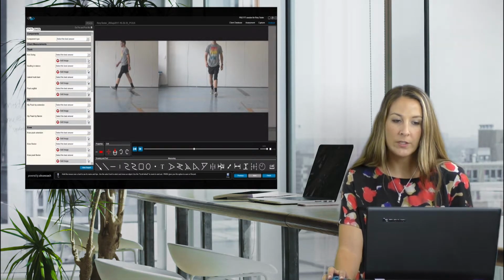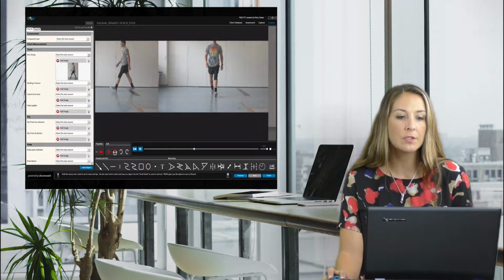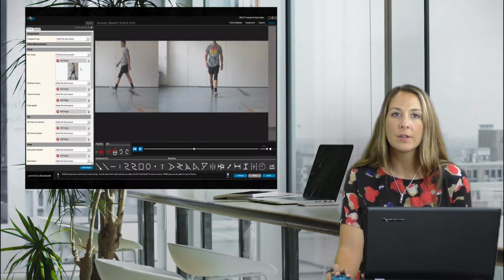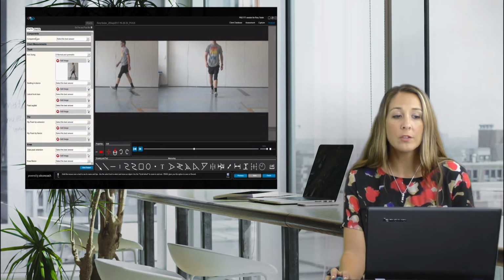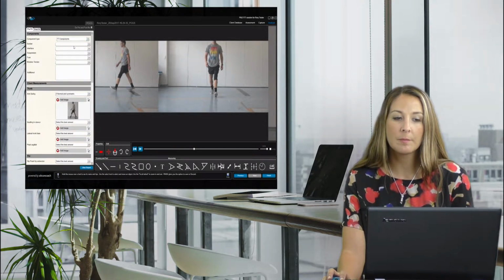And then we just hit this clipboard here, and it puts that image into place for us. And very similar to the way that the web-based software works, we just use the drop-down menu, and we'll pick one of those options. And those will compile the different answers that we have chosen, and then I'll put that all into the report. We also have a component type, just like the web-based software does as well. So you can pick which components the patient is wearing.